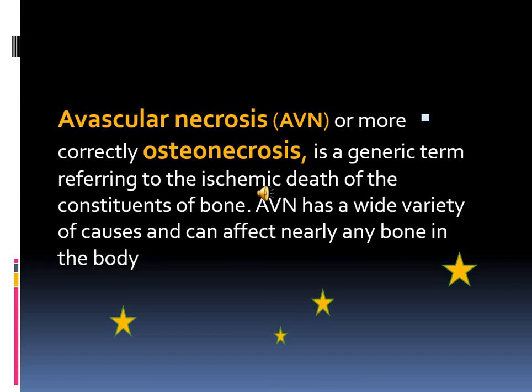So in this abnormality, what do we suspect? We suspect an area of avascular tissue in the bone. The bone becomes devascularized, and after that there will be density changes in that part of the bone, in the form of low density, sometimes fragmentation of the bone, and sometimes, as an end result, sclerosis of the bone. We can see this story in the remaining slides.